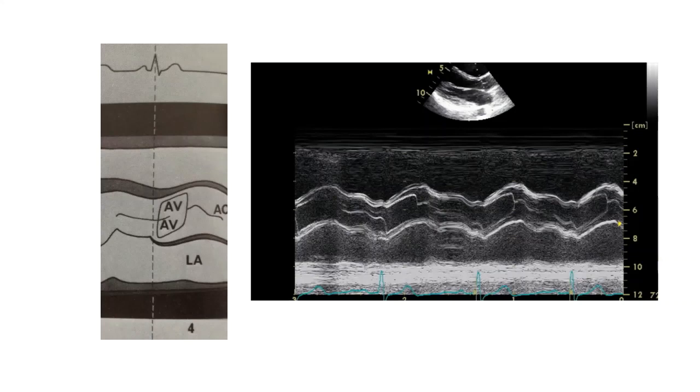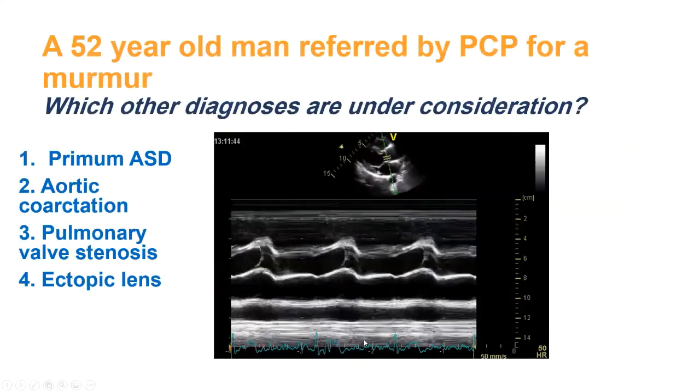And you've probably noticed at some point that when this aortic valve envelope is very short in duration, and by short, I mean let's say 200, 250 milliseconds, that is either indicative of tachycardia, or if the heart rate is normal, say in the 70s, a low forward stroke volume.